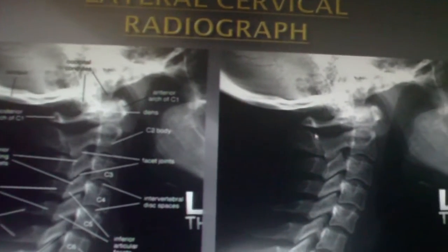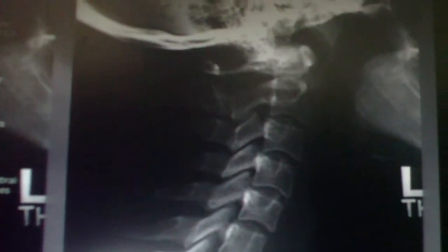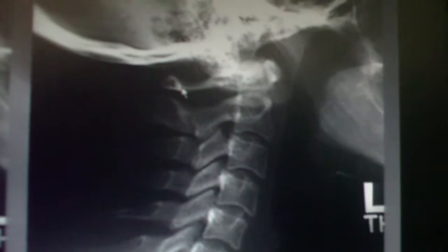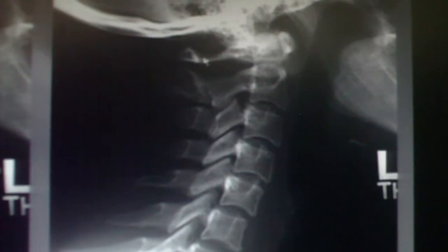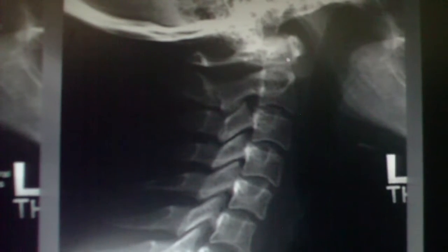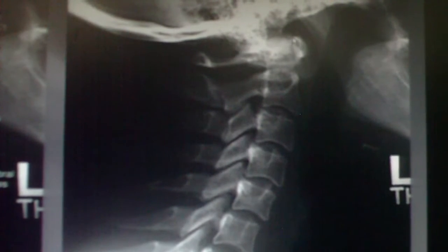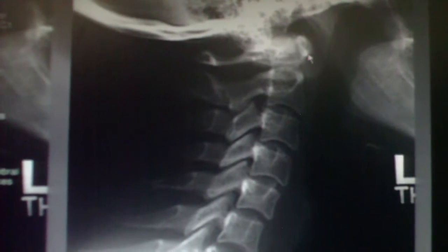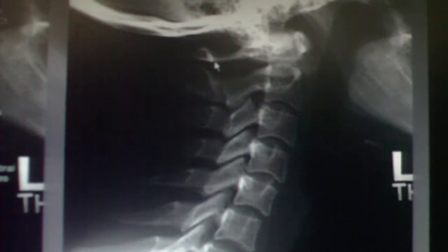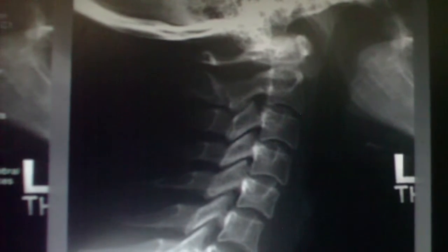Okay, going from back to front at C1, we've got a posterior tubercle, and we don't have a spinal laminar line here, but we can say that we have an anterior aspect to our posterior tubercle. Then we've got a posterior arch, which attaches at a synchondrosis to the lateral mass, which is in here. Right? And then we have a very short, or nubby, anterior arch, and we have an anterior tubercle. We said that if this little crust or ridge of bone is missing, the anterior aspect of the posterior tubercle, that 100% of the time you've got what?